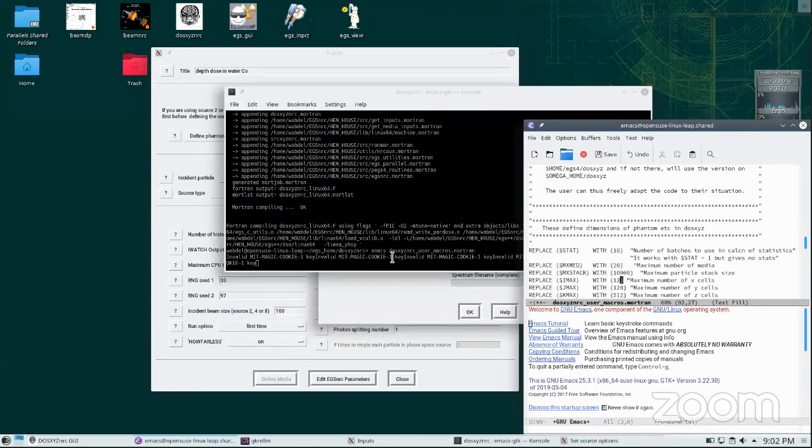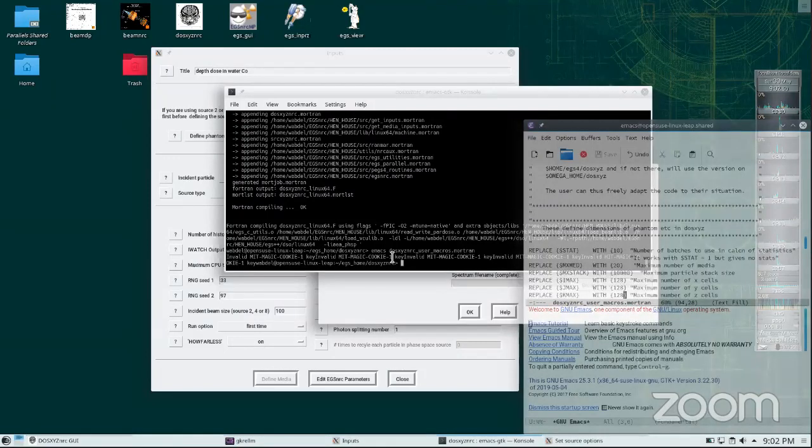128. And remember, the more you set this, the more RAM each simulation is going to take, around half a gig. So parallel processing is crucial because you might be limited to 4 gigs of RAM. Now, if you submit and do parallel processing of, let's say, 10 jobs, that's a problem. That's 5 gigs of RAM, and you don't have that. So that's why I keep them small, or usually will not take full advantage. That's when I talk about the Linux session.